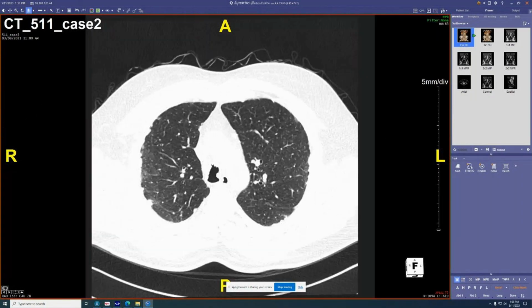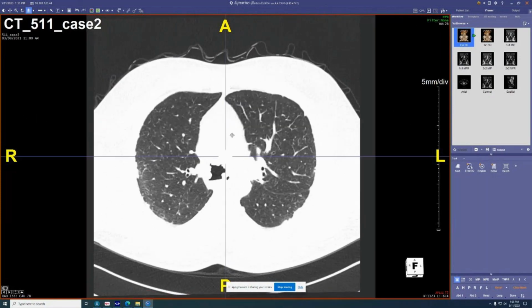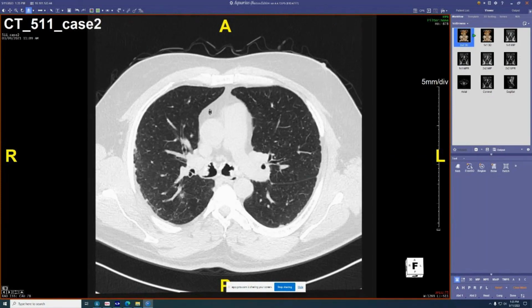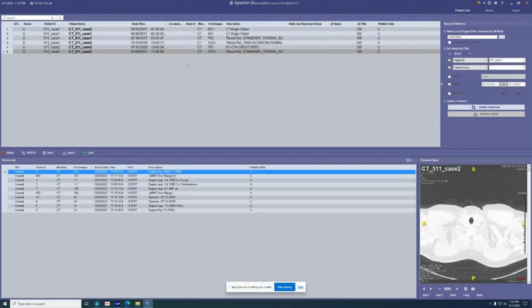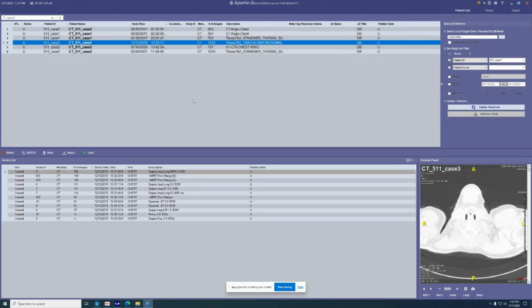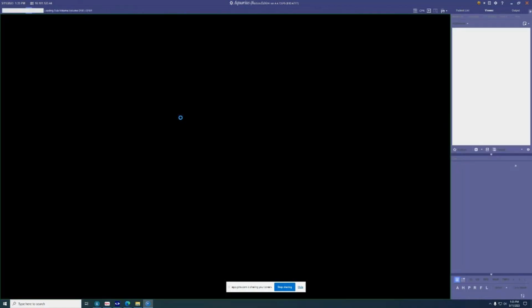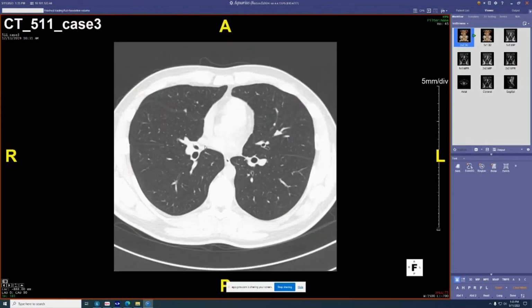Tracheobronchopathy osteochondroplastica in a patient with silicosis. But have you seen pseudoplaques like this in silicosis before? Again, I haven't seen tons of silicosis. Okay, well there you go. Do you know what the exposure was specifically? It was more fabrication of material. I have to look at the exact history, but it was material fabrication rather than like a miner.